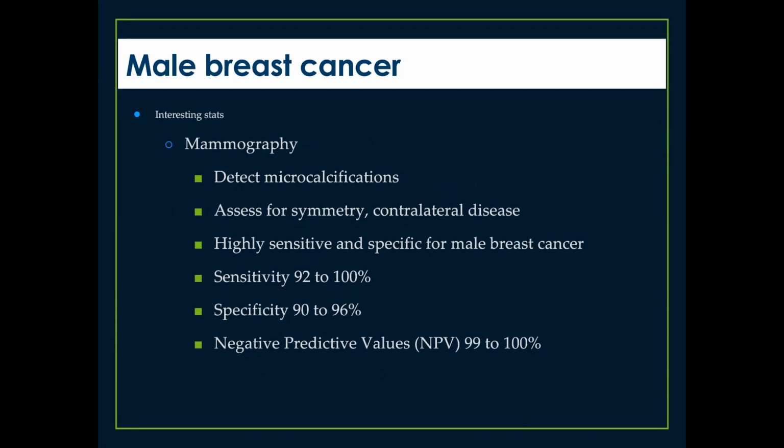So mammography is our main imaging modality for diagnosing male breast cancer. It's great for picking up microcalcifications that wouldn't be seen with the ultrasound or MRI. We can evaluate both breasts, and because there's typically background fat in male breasts, there's high sensitivity and specificity for detection of male breast cancer.